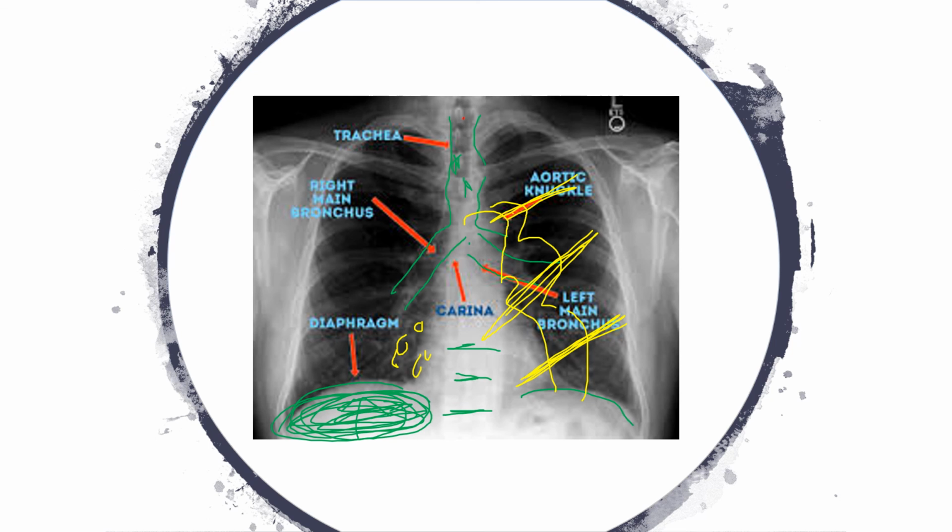When you're looking at these, also don't ignore looking at the bones here and there, even though these are not usually done. So you want to make sure that the bones are intact. You don't see a fractured clavicle, you don't see fractured ribs, things like that. And the other thing too is these ribs, these are posterior ribs because remember they curve up like a McDonald's arch. So because they arch or curve up, these are posterior ribs.